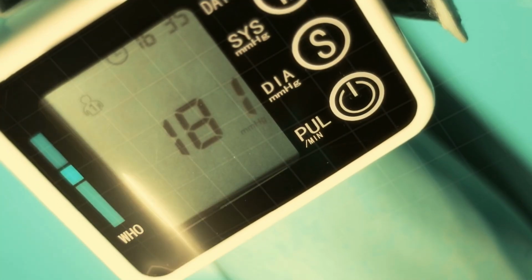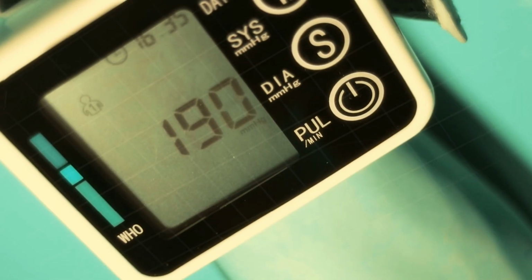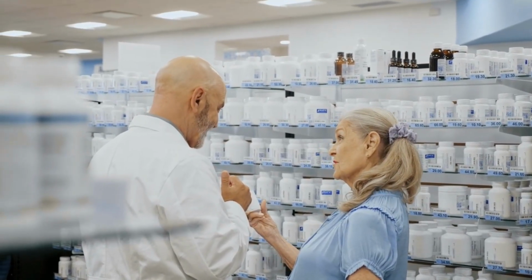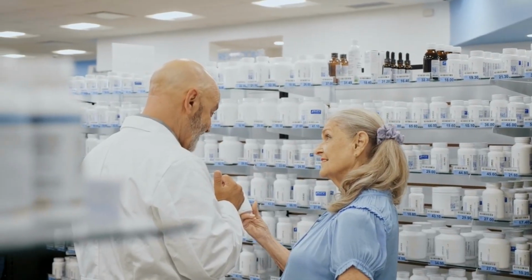Patients are monitored closely for several hours or days in the hospital to ensure there are no complications and that the stent is functioning correctly. Patients are usually prescribed antiplatelet medications to prevent blood clots on the stent and scheduled for follow-up appointments to track their recovery.